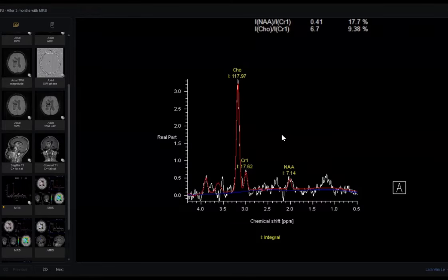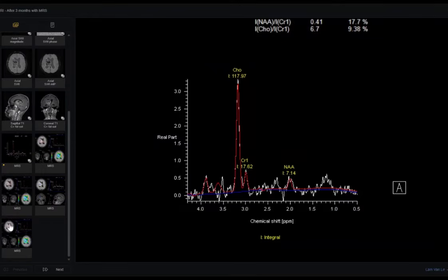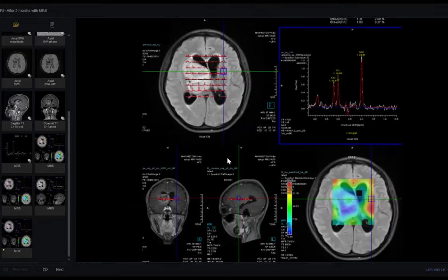See, not malignant. This is a mass lesion. In the brain we don't say malignant; we say aggressive or non-aggressive, or low grade or high grade. So at least we are talking about a mass. Is it clear for you? By the way, this is a very difficult case, so don't worry.